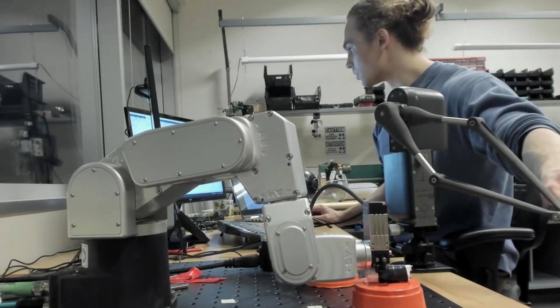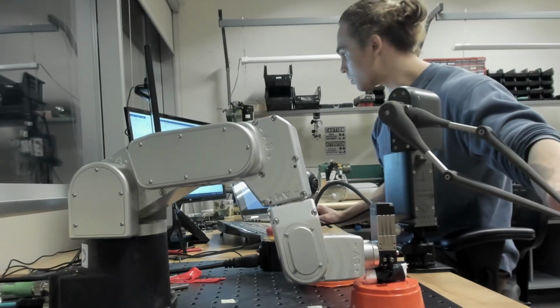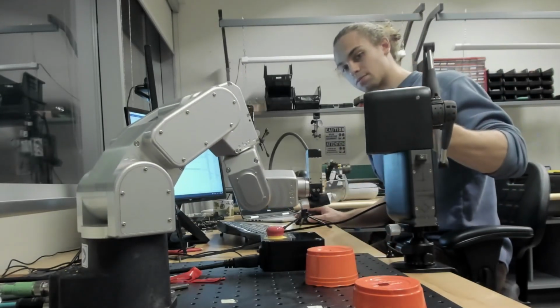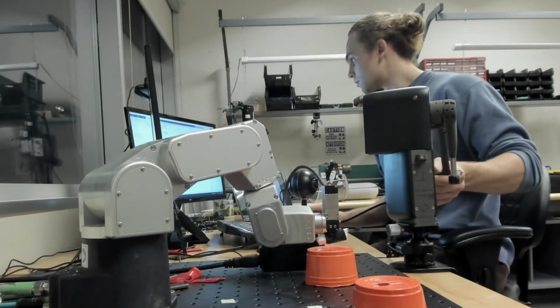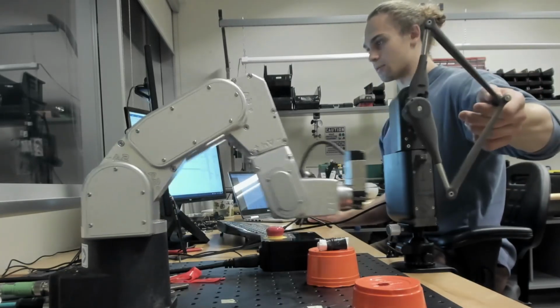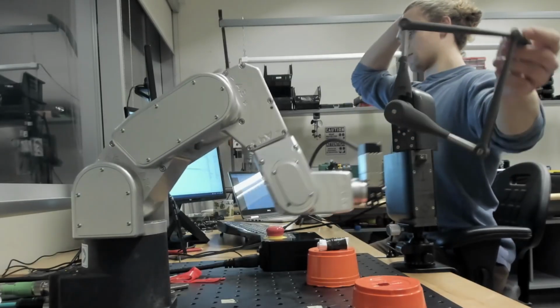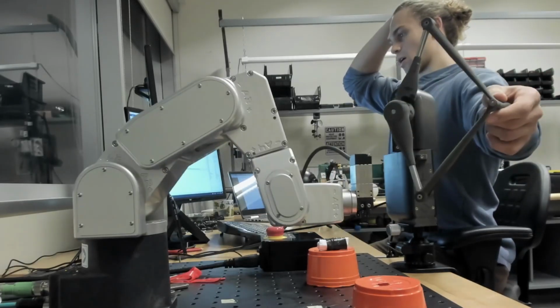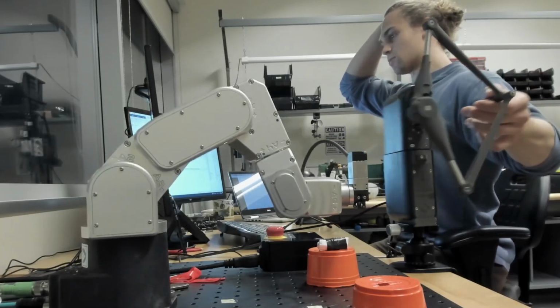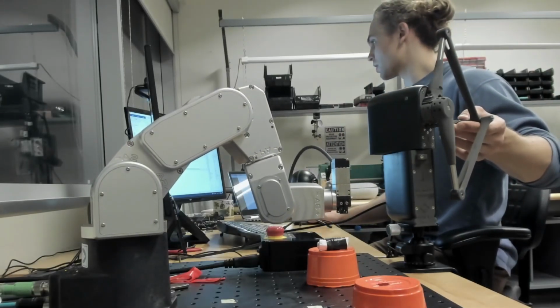Might be a little bit far away. Close it. Pick it up, bring it over here, put it down, and open the gripper. So I think with the joint commands, it's a little bit more responsive, especially because you're using velocity control. So you've pretty much got a PD controller here. I think the delay is reduced. So you guys can sort of tune this and map it to reduce the delay. But that's what that activity looks like.